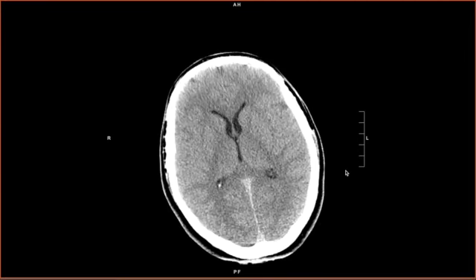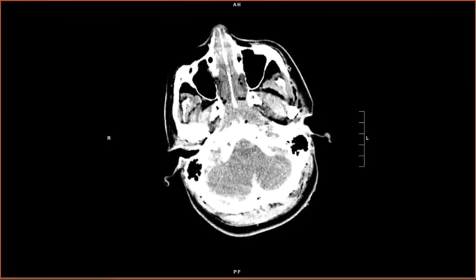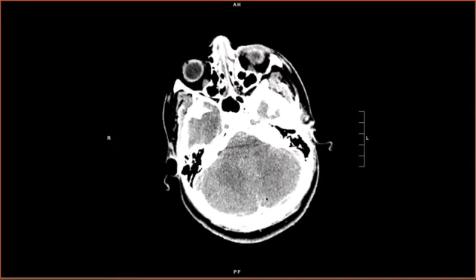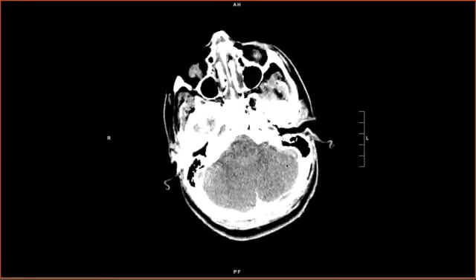This is another case. Here we talk about tonsillar herniation. This can be subtle and is probably the most often missed on axial slices. Tonsillar herniation refers to the downward herniation of the tonsils through foramen magnum. On every scan, you need to look at foramen magnum, which is right here, to make sure that it's not crowded. If there is even a question, you need to get sagittal reformats to assess further. This patient has tonsillar herniation and requires urgent decompression of the posterior fossa.